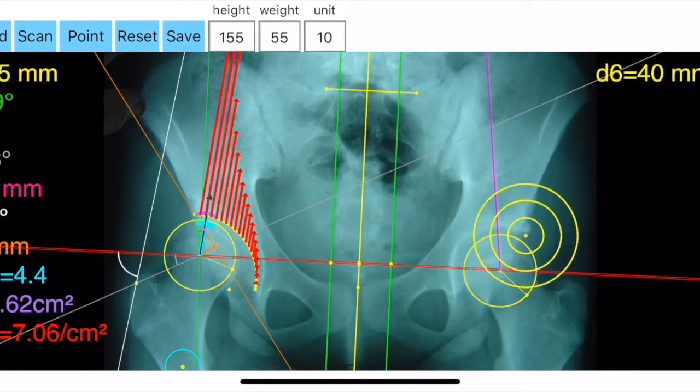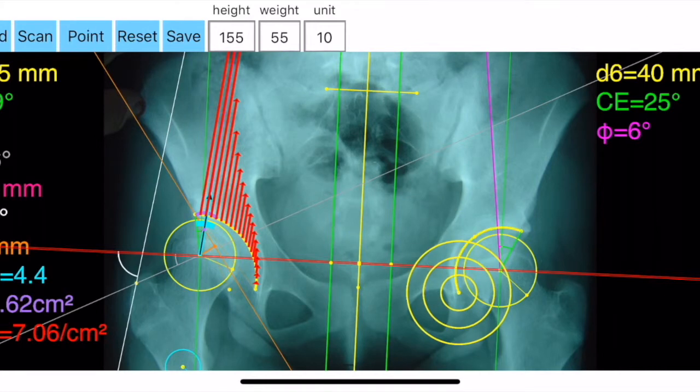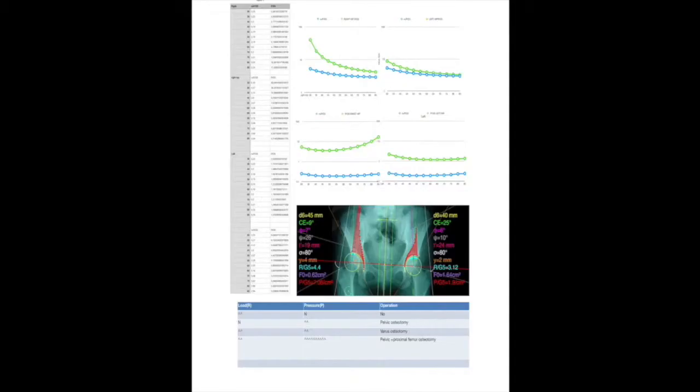Save the planned images. For later review or consultation, data are exported as a TXT file, ready to print or to input as cells to Numbers or Excel, ready for chart printing and further research.